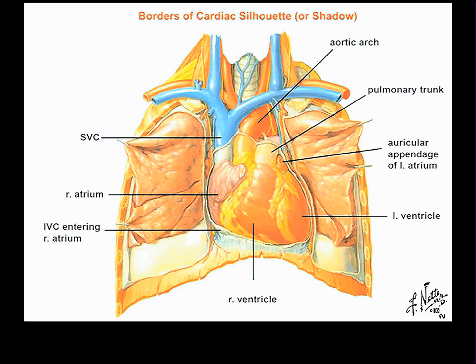the cardiac shadow. And it would reflect terribly on us if when you left this course, you could not look at a chest film and identify the borders and the structures you're seeing in the cardiac shadow. And as badly as it reflects on us, it's going to reflect worse on you.